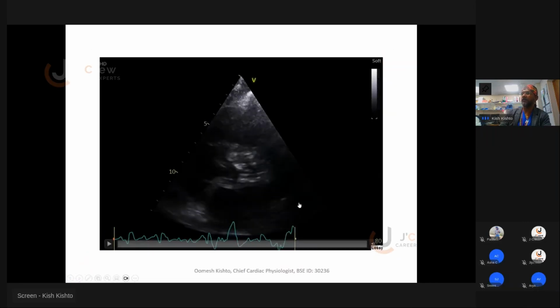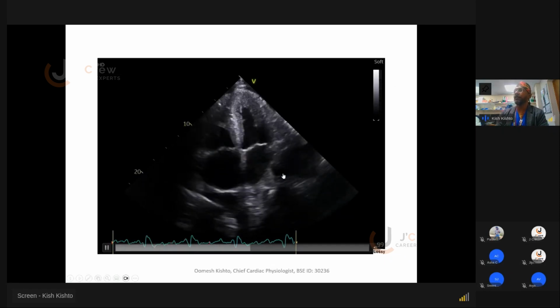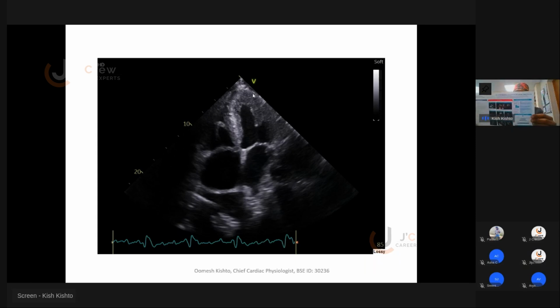If you go a bit further down. Okay, so that's the view, and then with an amyloidosis type of patient of the heart, you will see biatrial dilatation and a very speckly LV cavity. I believe the BSE recently did a new guideline, especially for assessment of cardiac amyloidosis. So by all means, if you can access the BSE guideline, you'll be able to see them there. Or I can ask Gigi to share this with you, at least to give you an idea.